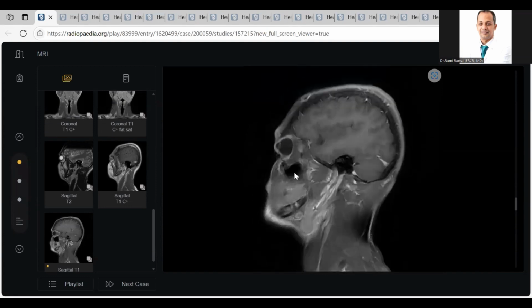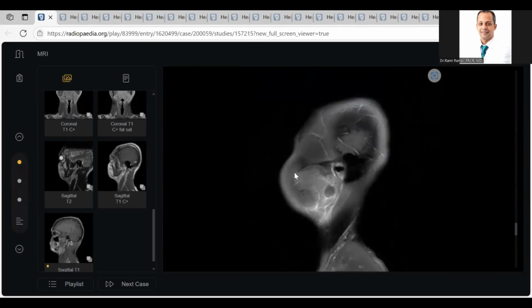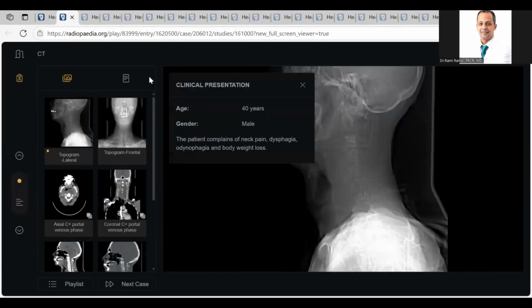Can you scroll from? This is a post contrast. What's your diagnosis? Post-contrast ring enhancement. So it is a parotid abscess, and I would urgently convey my finding to the referring clinician for the drainage of the abscess and for an exacerbating factor. Thank you so much.